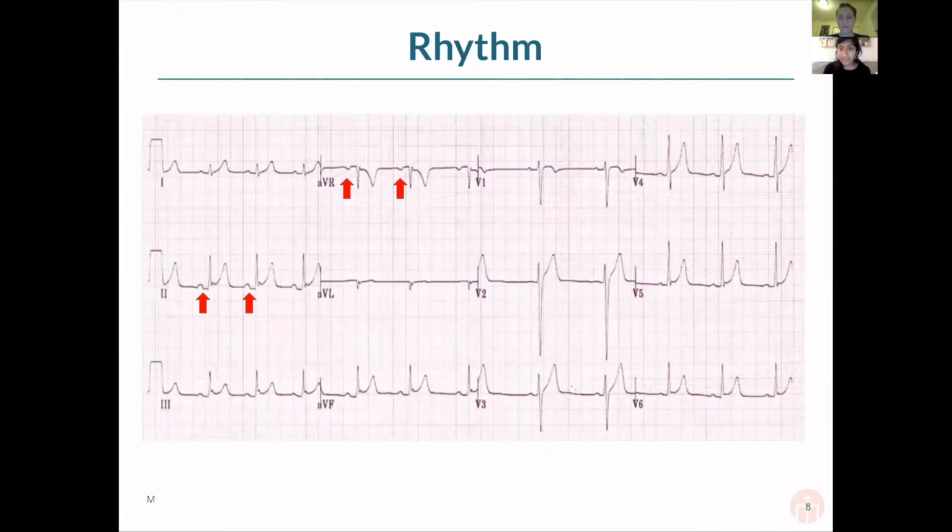I will say that for the purposes of Step 1, there are a few particular EKGs to know more than others, which we will again get to later. So certainly there are situations where you need to know AVNRT, AVRT, all of these very specialized EKGs. And those are a lot of the time, unfortunately, the best answer I can give is just pattern recognition. It will be looking at those EKGs over and over again and identifying where those Ps are, where they're coming in relation to the QRSs, and establishing those relationships. Those are not the ones you'll need to know for Step 1.